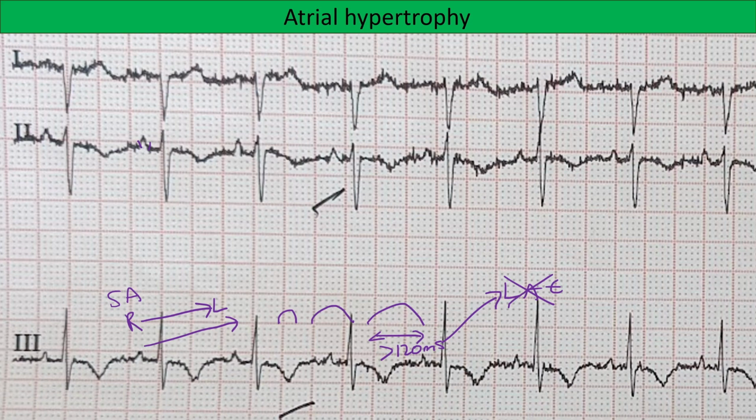Now for right atrial enlargement, we look at the amplitude of the height. So we go from here to here, and we see there's about 3 small squares, which is 3 millimeters. Now anything greater than 2.5 millimeters is suggestive of right atrial enlargement. So therefore this patient's ECG is very suggestive of right atrial enlargement. Remember, ECGs can only be suggestive. These diagnoses have to be confirmed in an echo.